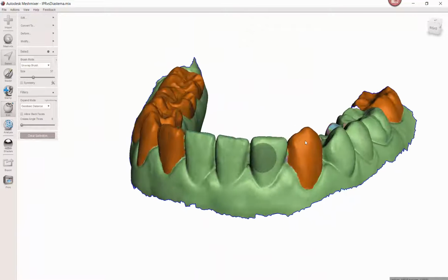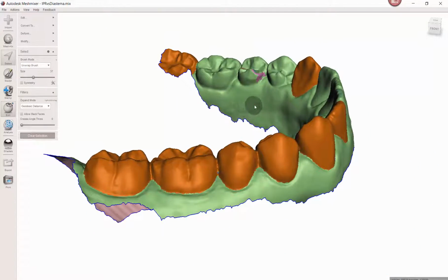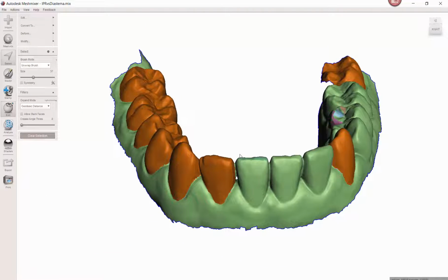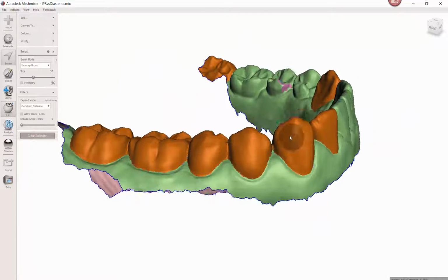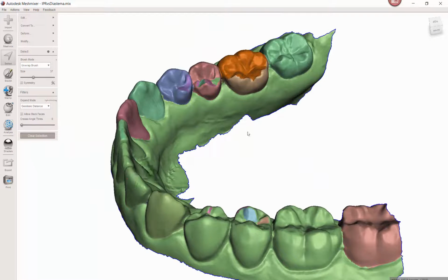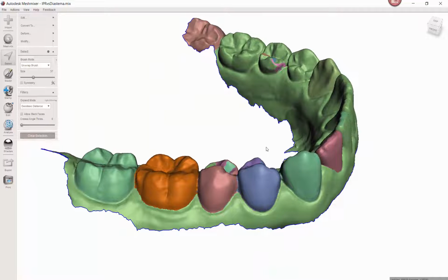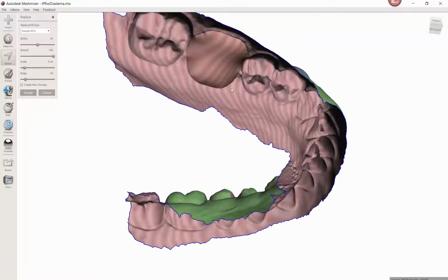The rest of them did not. And again, that comes down to giving it really defined margins. And sometimes you get lucky, sometimes you don't. So anyway, hopefully that helps. That might be a little idea for you guys. Because to finish this up, segmentation, extraction. Well, if I want to, I can double click this tooth, get this inside. And now I'm back to my normal tools. I can hit the F button for erase and fill, change out my scale. My other videos go over this, and now I've got an ovate pontic site.